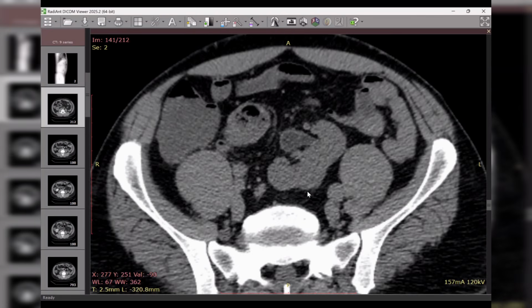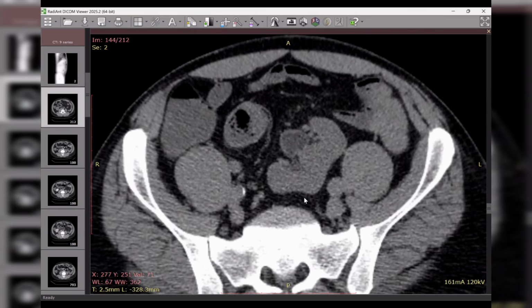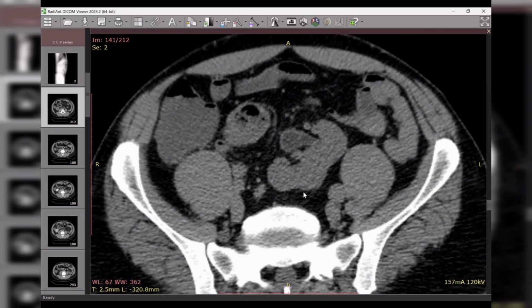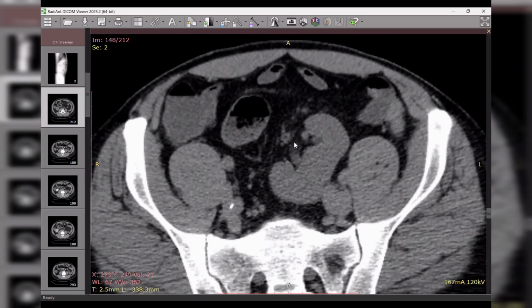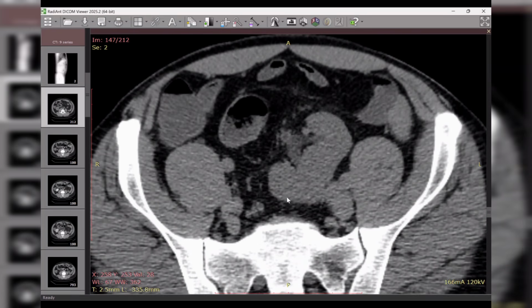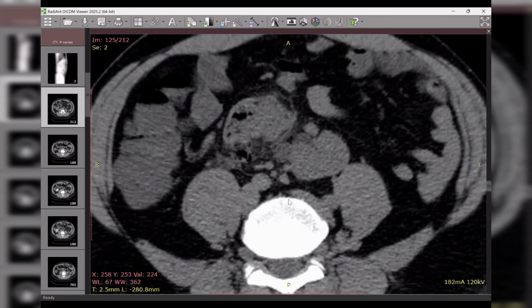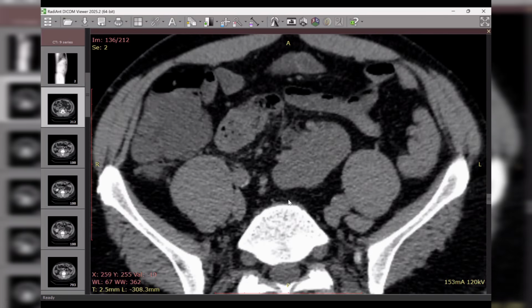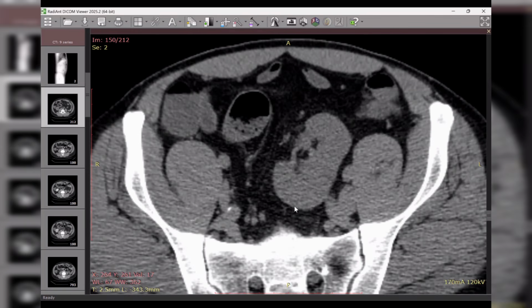Marvelous. So what happened? I think it's causing reactive urothelial thickening within the ectopic left kidney. Yeah. Excellent. Good. Go ahead. You picked it very well. What do you want to complete or to confirm your scan? I will want to look at the post-contrast sequences.